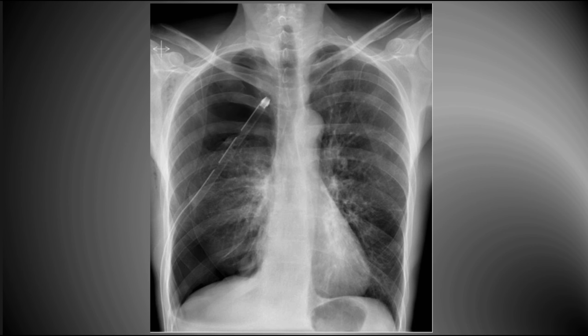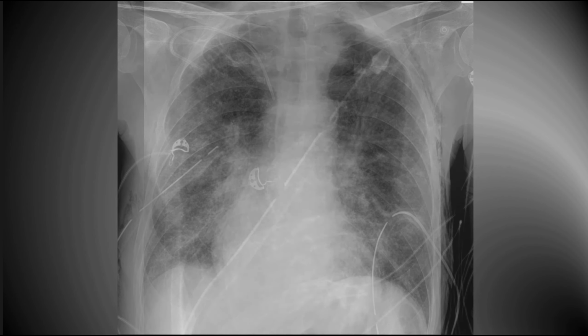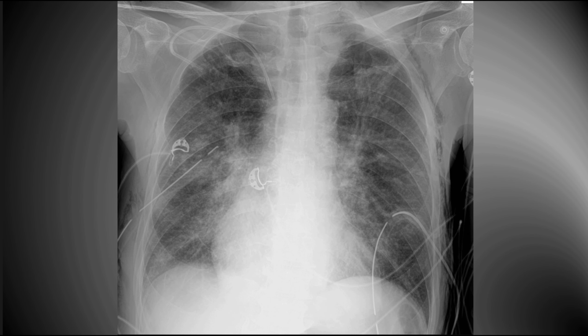Here is a chest tube in situ. Note the lung edge. I'm going to zoom in on this. There are two drainage eyes in the chest tube. Here they are highlighted. Both of these eyes need to be inside the pleura for the chest tube to work effectively. If both eyes are not in the chest, then air can leak into the chest wall and cause significant subcutaneous emphysema.